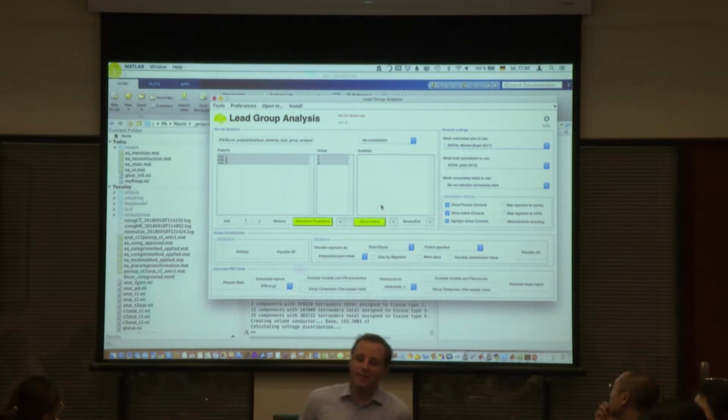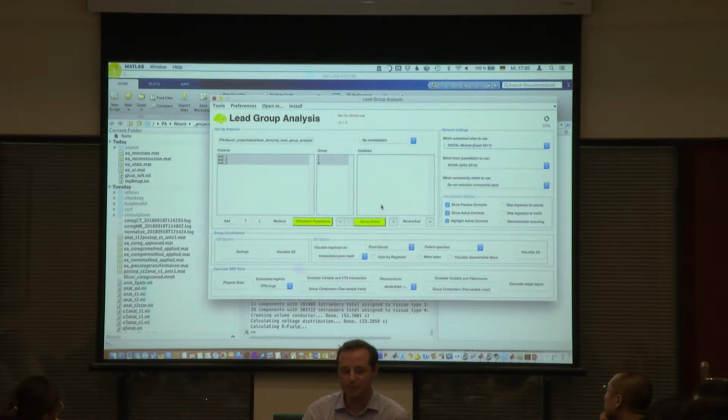The reason is really that there is so much parameter freedom if you allow everything that it gets really complex, also from the GUI perspective. And in the beginning we thought 95% will be 2 electrodes and so on. So for everything else you basically need to script a bit yourself, and it's not so complicated usually.